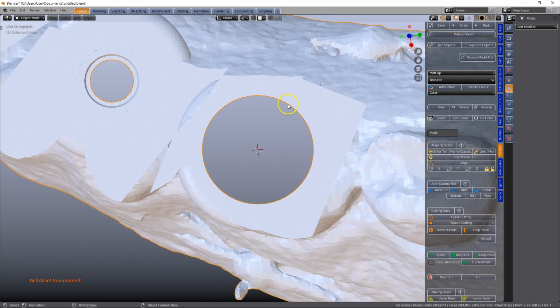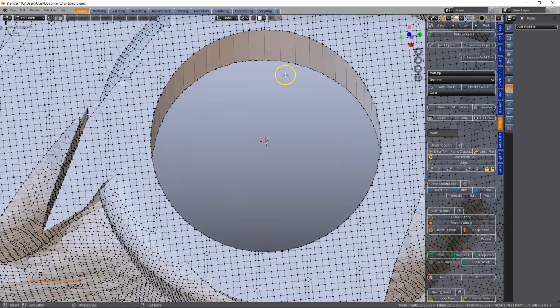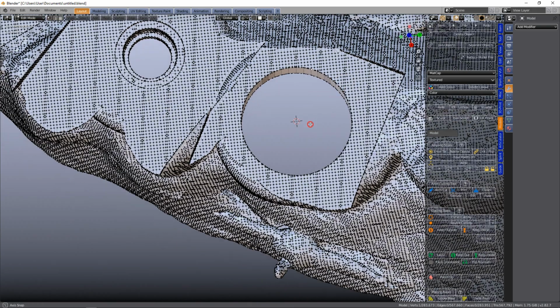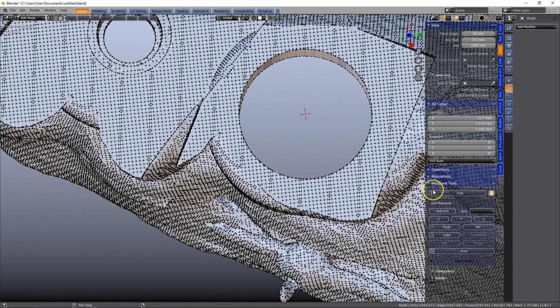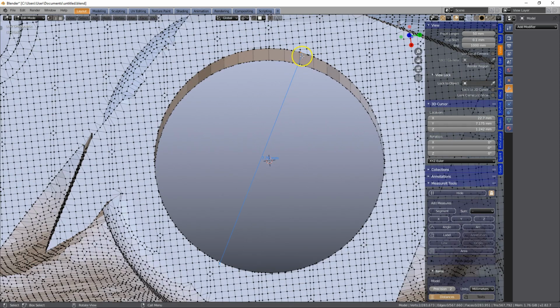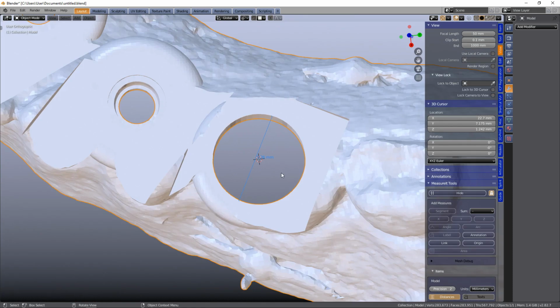If I were to measure this hole from one side to the other, I'm going to select one here. It may not be exactly accurate because I may not go through the midpoint, so I'm going to select one of the opposite ones, then view, and in my measure toolbox I'm going to click on segment, and I'll have a look at 7.26, but had it gone through the middle it would have been exactly 7.3 millimeters.